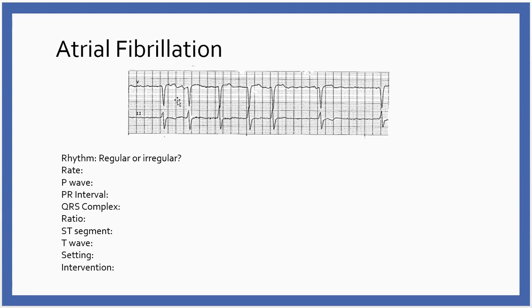I can still measure the QRS on the V-lead, from the beginning. By the way, in V-leads, QRSs should be downward like this. That's the way they're supposed to look, so don't worry about trying to flip the strip. So this is my R wave and my S wave. I'm going to measure from here to here, and this is a little bit wider. So my QRS from there to there is a little over 0.12. It looks like maybe 0.13 or 0.14. So I have a little bit of a wider QRS.